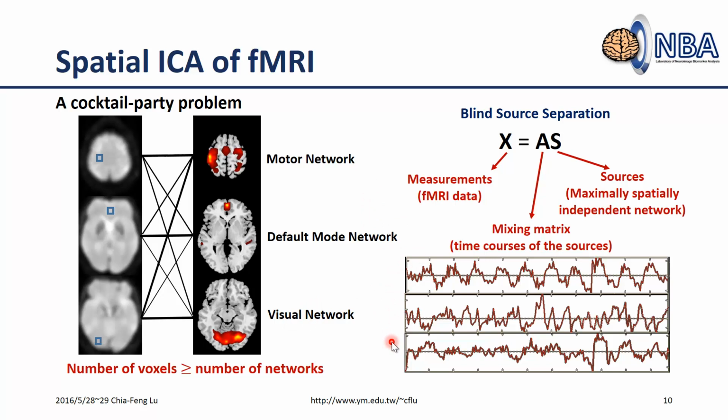time courses. And these time courses are kind of the representation of the mean or average, but not really the mean or average. It's kind of the representative signals for each network. So you can see, for example, this is the motor network, and the IC signal or time course is pretty similar to what we designed for this fMRI data set.